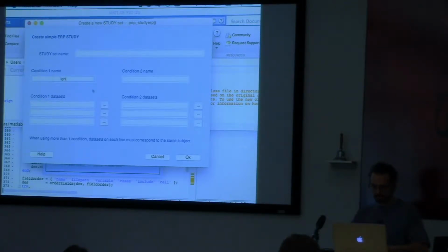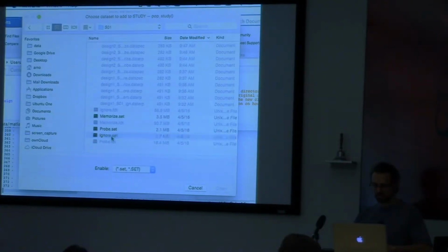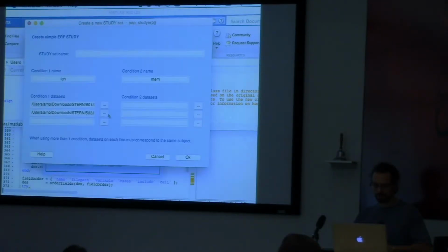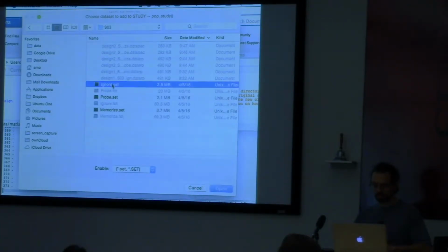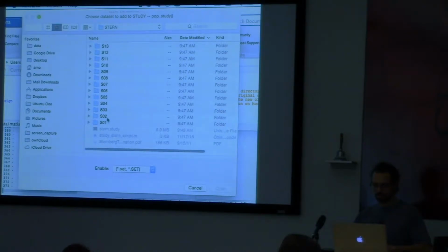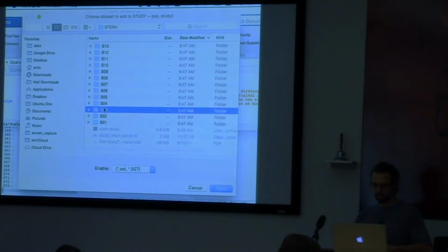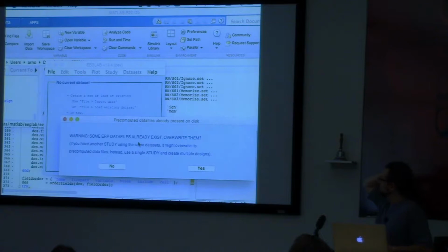And then you type ignore here, memorize here, get your subjects, S01 ignore, S02 ignore, S03 ignore, memorize, and you press OK.